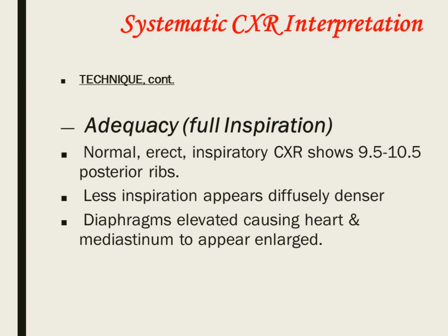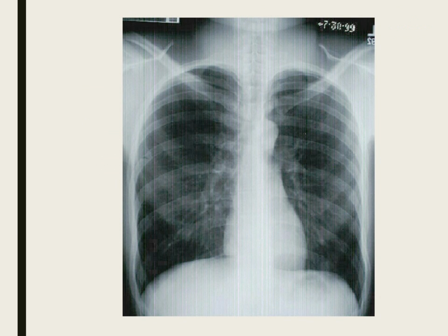It's kind of tough to do on people on ventilators, right? I mean, the perfect thing would be to call RT for an X-ray and put them on inspiratory hold. We don't do that, but the quality would be better. When you do an X-ray down in imaging, it's a good idea to take a deep breath and hold it, obviously for a few seconds. So that's a pretty decent-looking X-ray.